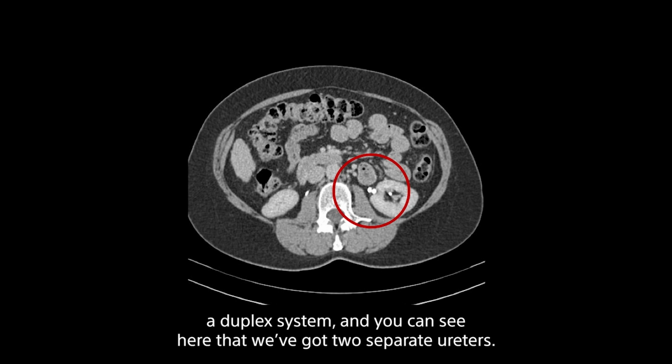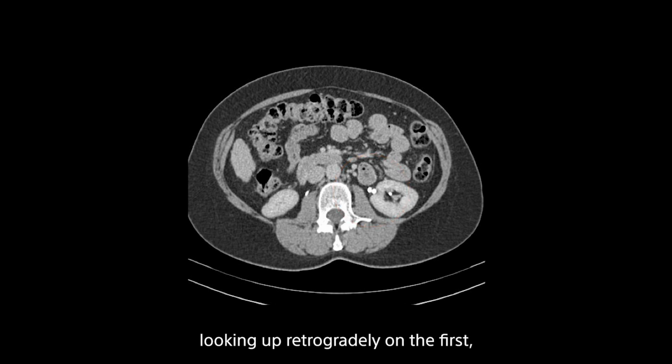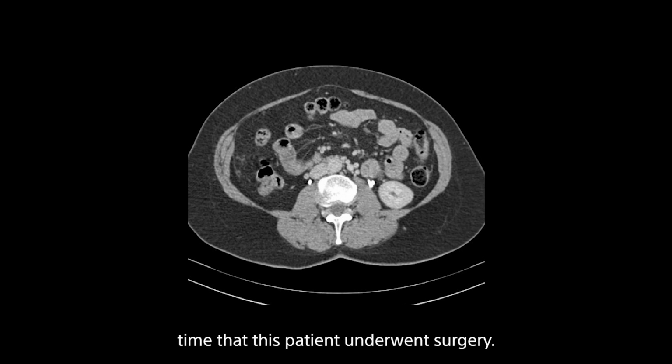The other thing that you'll note as we go through this contrast CT is that we've actually got a duplex system. And you can see here that we've got two separate ureters. And so that maybe is the reason that we didn't see the calyceal diverticulum looking up retrogradely on the first time that this patient underwent surgery.